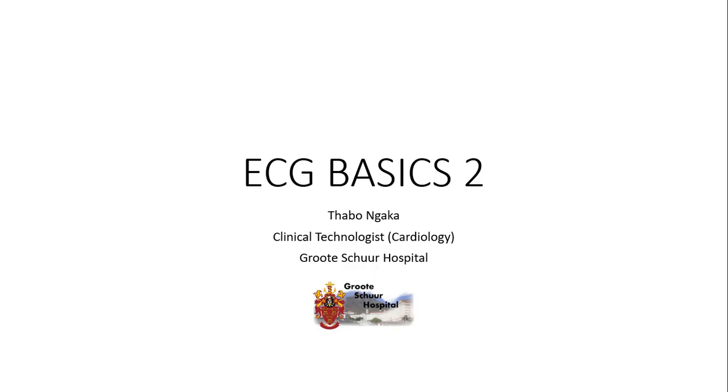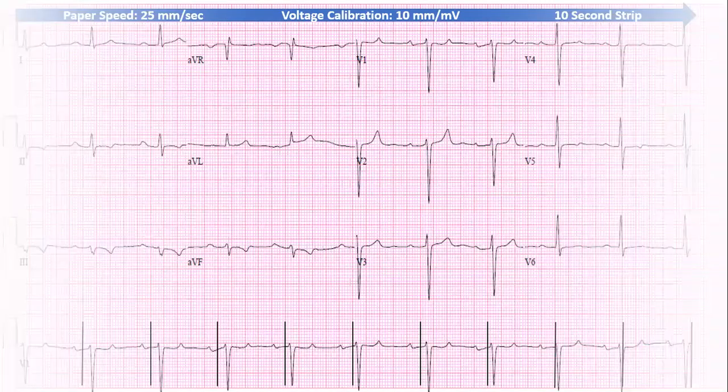So this time around, I'm just going to show you how to calculate heart rate on an ECG. I'm only going to show you, I think, about two methods. They're very simple and straightforward. I know there's more than that, but the rest of it, you can just read up on it and see how it's done. So first things first.